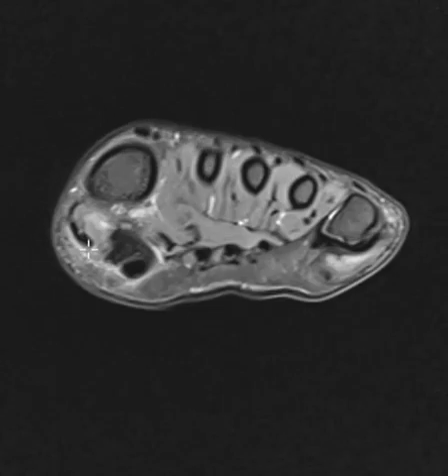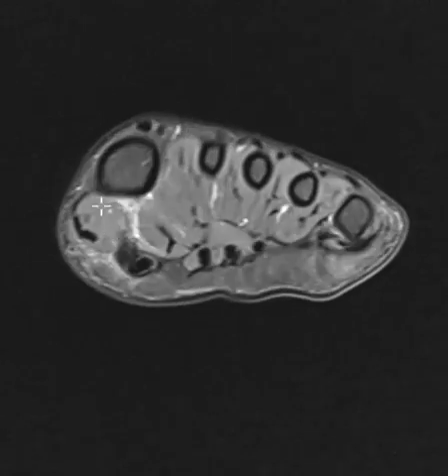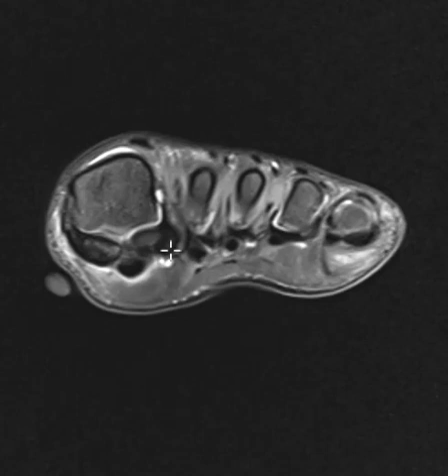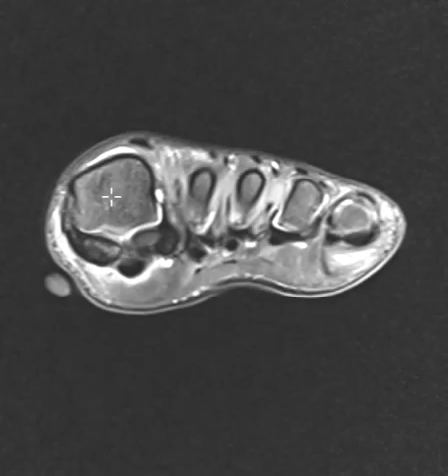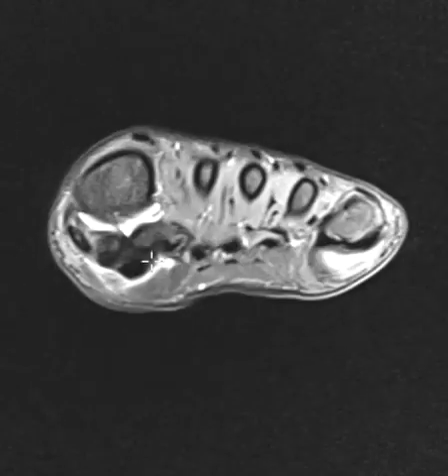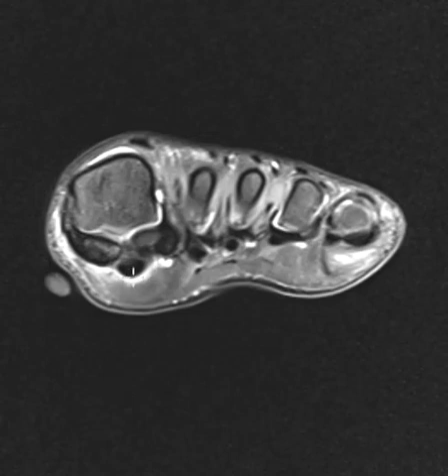It looks like the central tendon of these muscles, but this is actually a separate central tendon. This is the abductor hallucis tendon, and this is that muscle here, the two medial muscle bellies. And over here we have the adductor hallucis, and they're also going to form part of this plantar plate. They're going to hang out the far lateral side and medial side here. And between the sesamoid bones we see a little dark area right here, the sesamoid ligament right there. That looks like it's intact. And also we see the flexor hallucis tendon right there looking normal.